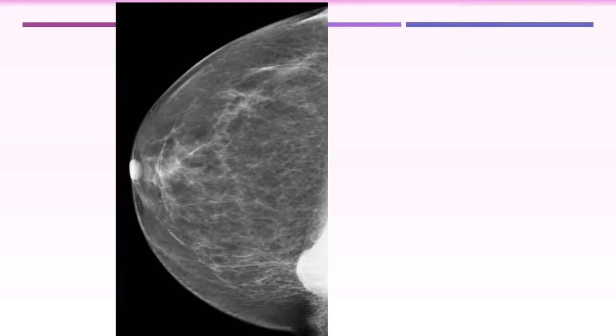You said it is a circumscribed mass. Yes. Could you see the deep portion of the mass? No. So it is partially circumscribed. The visualized part of the mass appears to be circumscribed. As a radiologist, we have to describe what we have seen. So it could be a high density mass projecting over the pectoralis on the medial aspect of the breast. Differential diagnosis includes sternalis muscle as a variant.